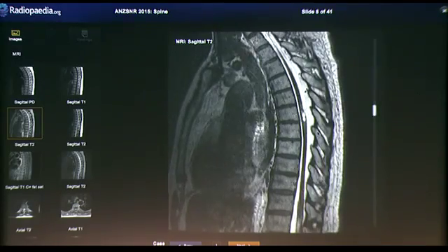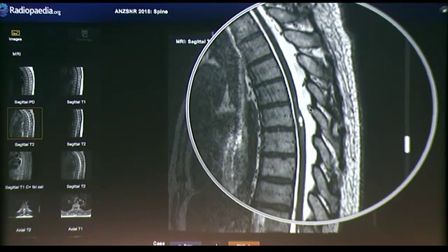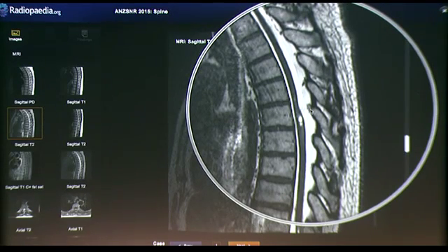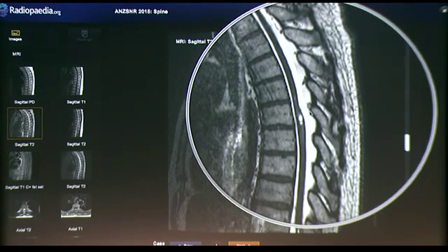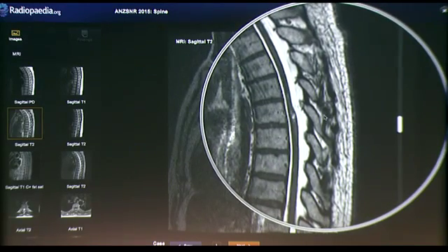And so the final thing to consider is a dorsal arachnoid web. There are two findings here which help point us in that direction. One of the signs for a dorsal arachnoid web is said to be the scalpel sign. The idea is that the focal indentation of the cord has a shape like an upside down scalpel blade. The other useful associated finding, which is not necessary for the diagnosis, is the presence of syringomyelia, which is present in probably more than half of the cases of dorsal arachnoid webs. So that's a nice supporting finding.